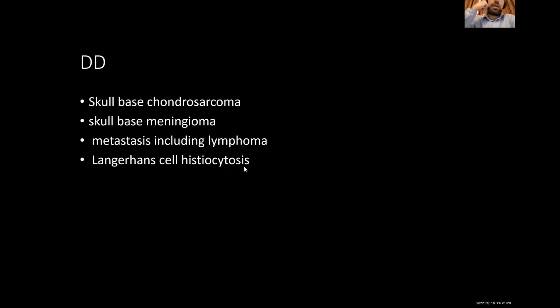Brainstem glioma, no. The epicenter, the main bulk of the lesion, should be from the brainstem down, and this would be associated with hydrocephalus. Plasmacytoma: we speak about myeloma, multiple myeloma, and this would be a single lesion of multiple myeloma, but it was a far differential from my mind. Okay, I will not call this differential.